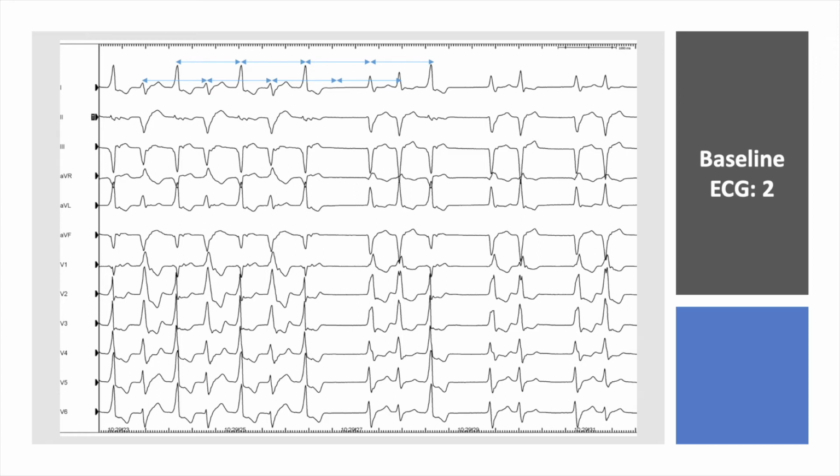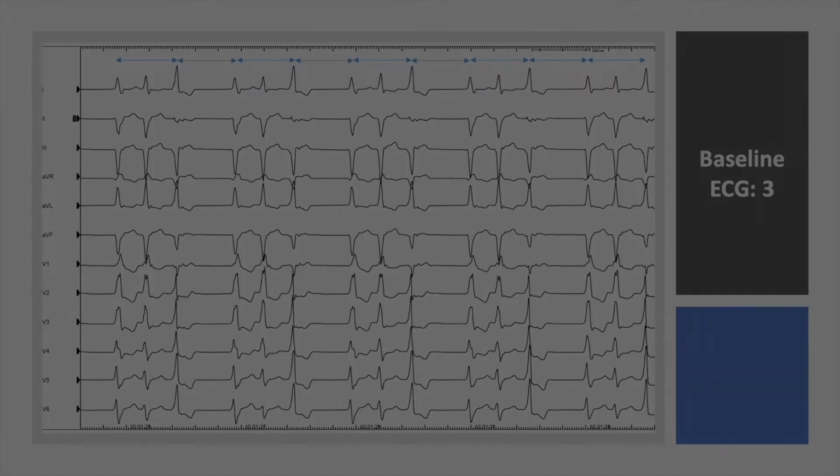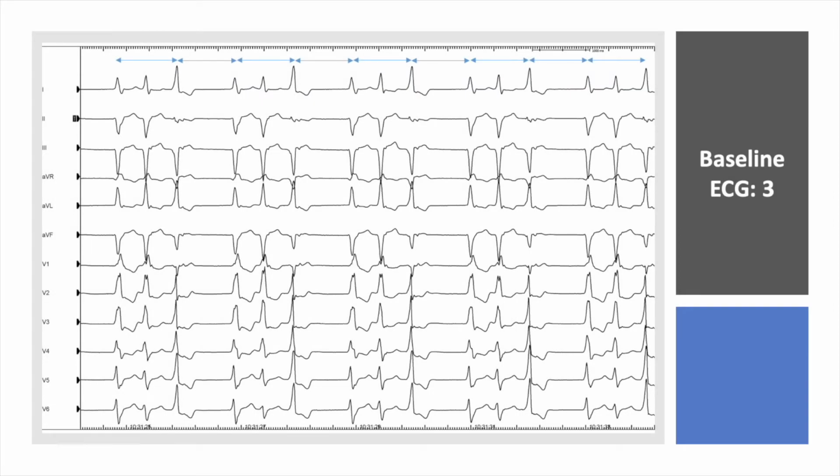And this is an interesting example of ventricular tachycardia, sustained ventricular tachycardia, most probably with exit block in the VT circuit. In another ECG of the patient, we observe the same phenomenon. It looks like group beating, but when we follow the cycle lengths and the intervals between the QRS complexes, we can realize that still we have a sustained ventricular tachycardia with exit block at the VT circuit.